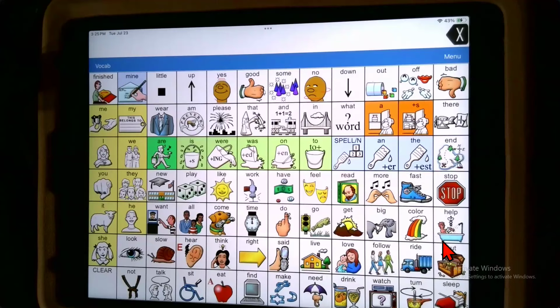Yes. Okay. All right. I hope everyone's feeling good about it so far. What you've learned to do is copy vocabulary. You've learned how to save a vocabulary, and you've learned how to reset the main page, and you've learned how to steal a page from one kid's device or from your device where you've done something that you think is clever and you want to import that page to another person. You now know how to do that. All right, that's a good start.